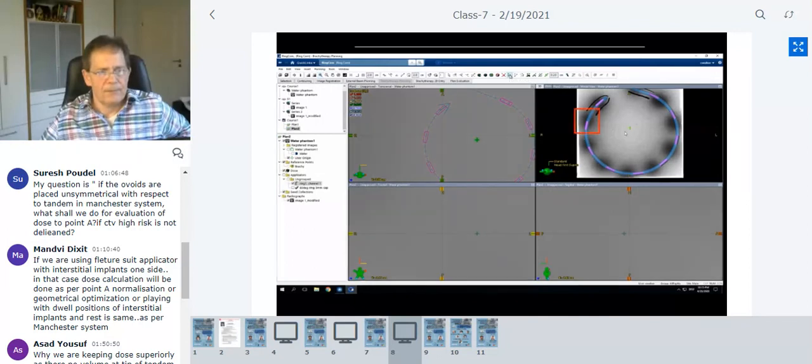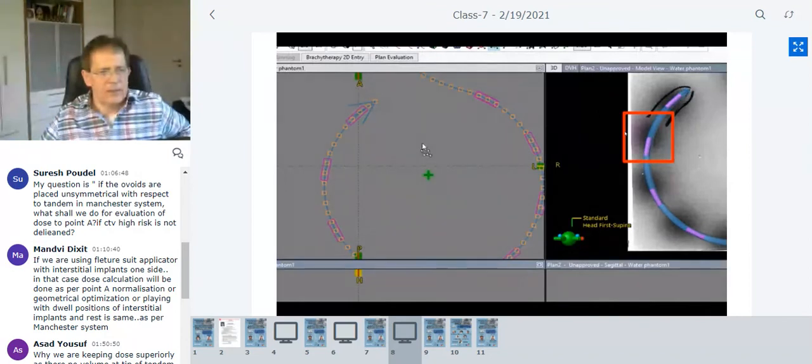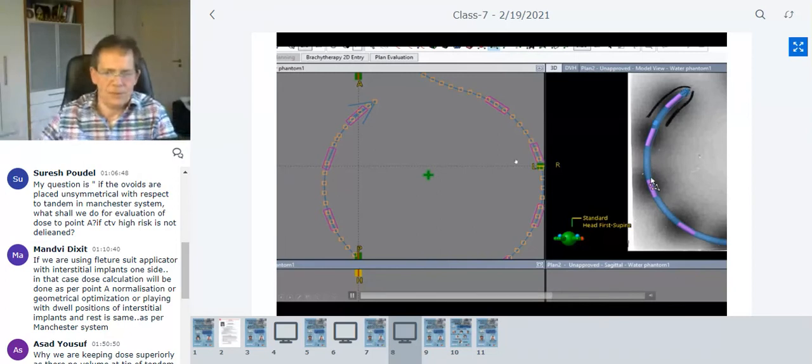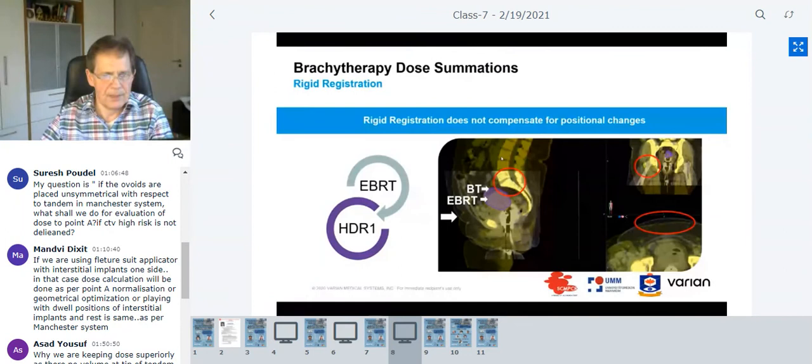So you have actually the channel, and you can now move channel points. So I want to move this first position here. And you see what happens? I overlay the first position from the planning system with my spots that are measured with the autoradiograph. And if you do that for all these positions, I can skip that. In principle, I think you understood how that works. Then you can save this as a standard plan. Last 3 slides.